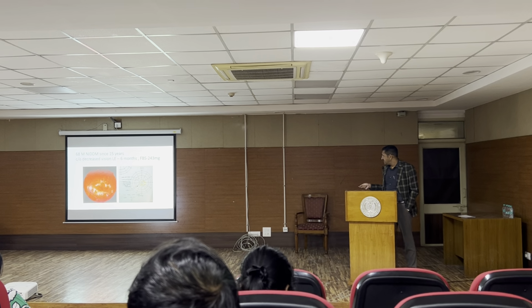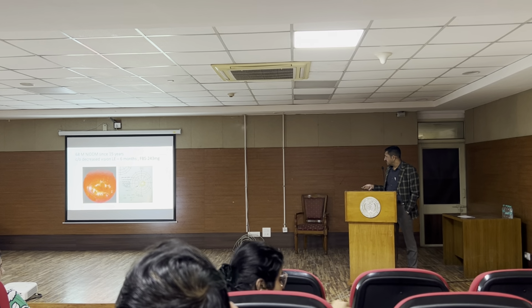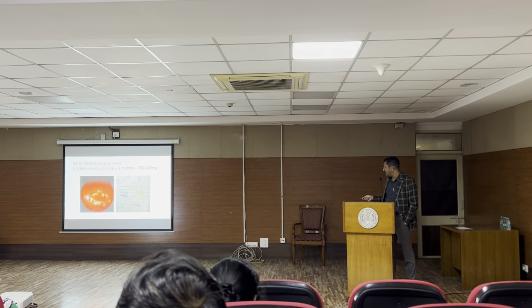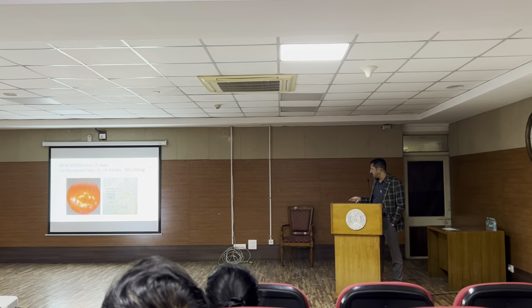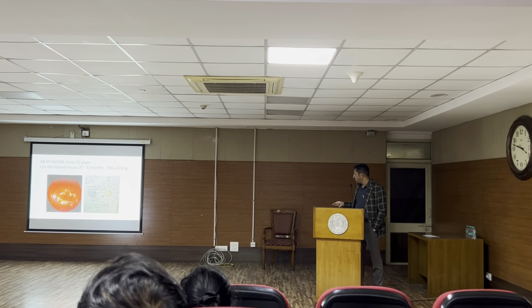So all these findings we have drawn here, and these are the colors given to each finding. Hard exudates are drawn in yellow. There is retinal thickening in the macular area. So retinal thickening is drawn in blue.